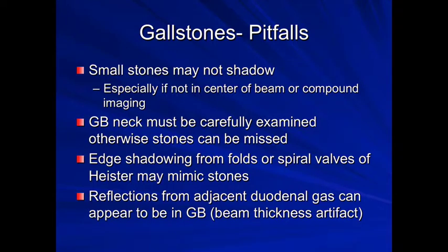So what are the pitfalls when scanning gallstones? Well, firstly, a small stone may not shadow. If the stone is small enough that most of the energy from that ultrasound impulse will still get past it and be reflected back, then you won't get the shadowing. And so this is particularly seen if the stone is very small, or if it is not in the center of the beam, and so most of the energy goes down past the side of the stone.